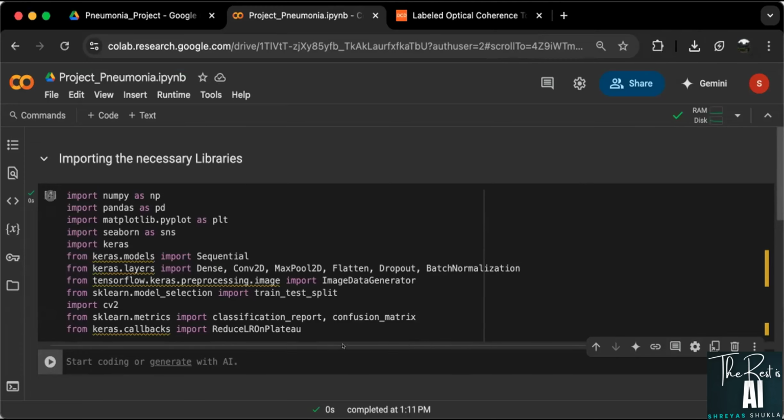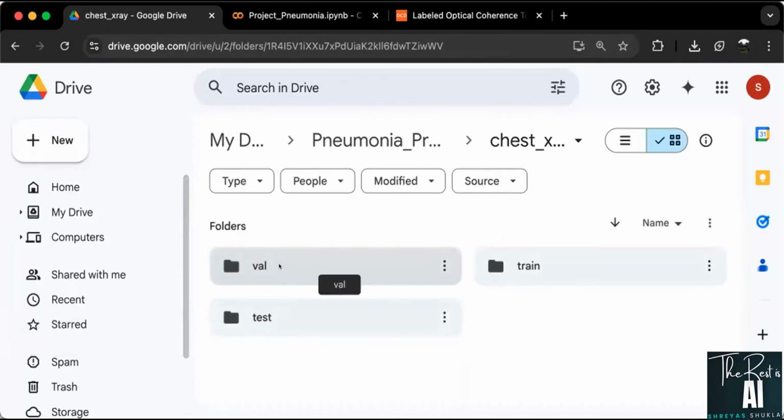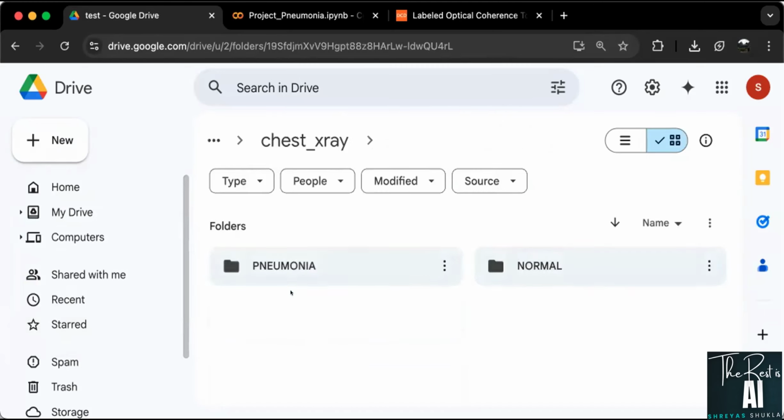Right away, you can see that in our dataset, this was the folder that I discussed. So you can see that I had just the X-ray folder, then I had this kind of subfolder. In this subfolder we also have these two folders again. Now using this, we have to kind of get our data one by one, that is get our images one by one. So this is what we'll be doing now.